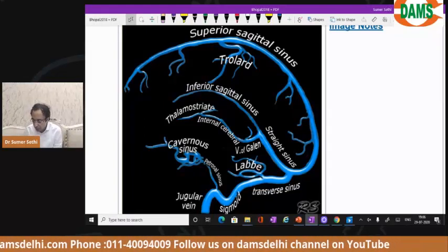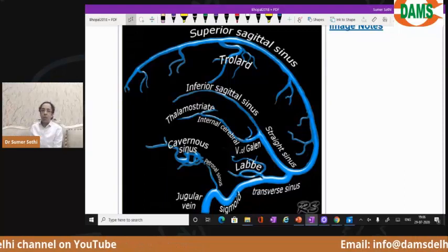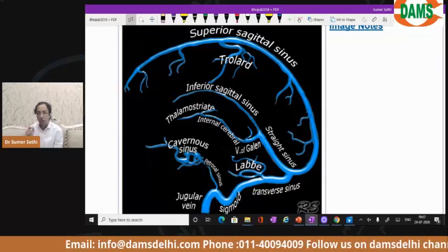Okay? Yes. बिल्कुल ठीक है. I think most of you are able to pick it up. पहले thrombus दिखेगा, बाद में edema दिखेगा. But you may not be able to see thrombus in many patients. तभी CT इतना अच्छा नहीं है. Okay? I will answer all these questions again when I show you MRI.